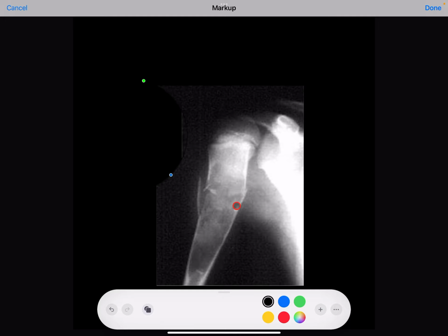We can exclude non-ossifying fibroma because non-ossifying fibroma will be eccentric and corticated. We will also exclude chondromyxoid fibroma because it will also be corticated and eccentric in location. In this way you can narrow your differential.